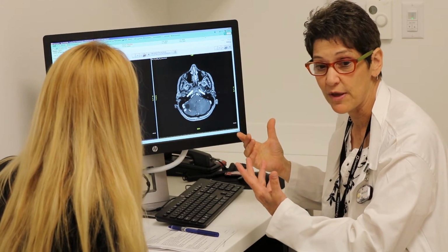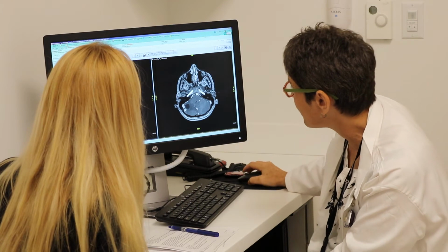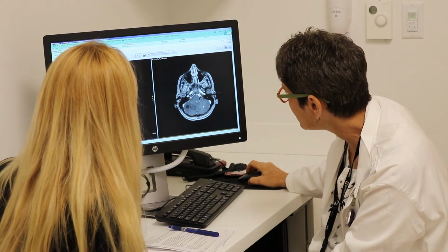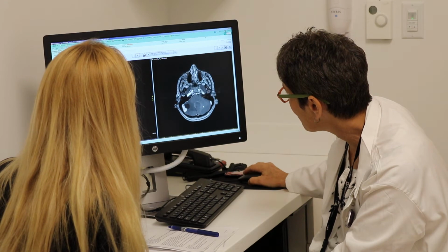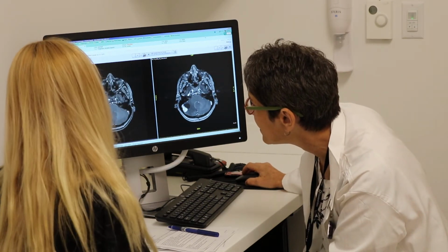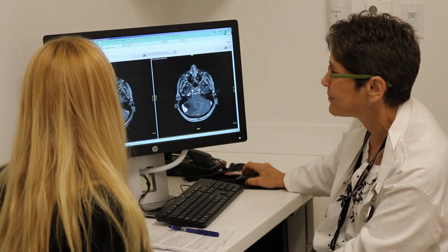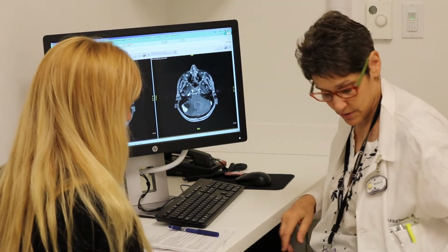That has to do with the phase they did the imaging. So this hasn't changed, it's about the same, and the other one is just above that, and there it is over there. Those 2 are very small.